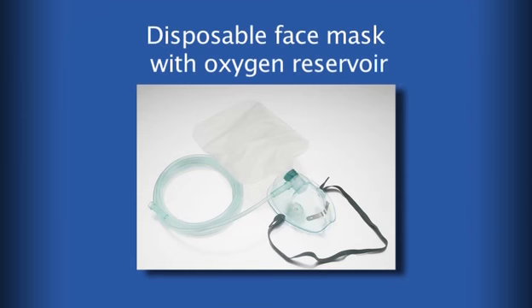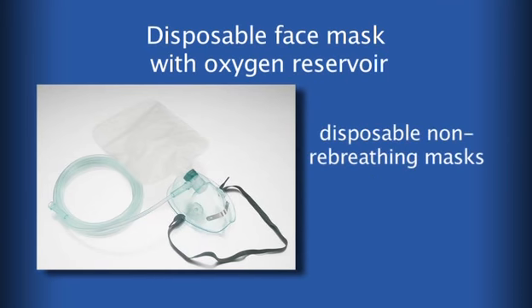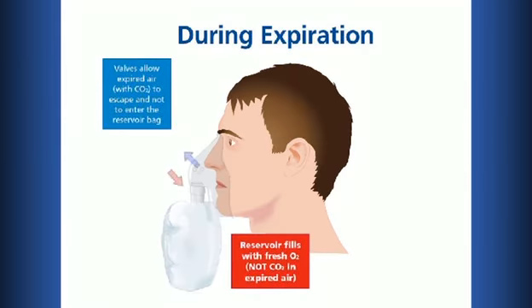Disposable face mask with oxygen reservoir. These devices are also known as disposable non-rebreathing masks or 100% masks. They use a reservoir bag to store some of that oxygen that would otherwise be wasted during the pauses before and after inspiration, as well as during expiration.